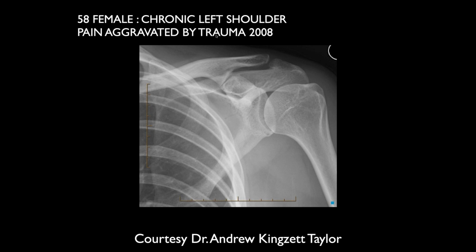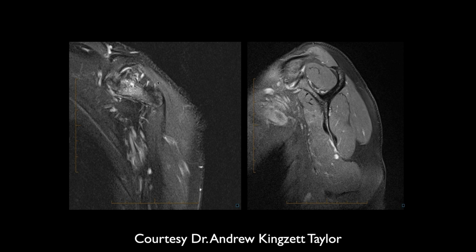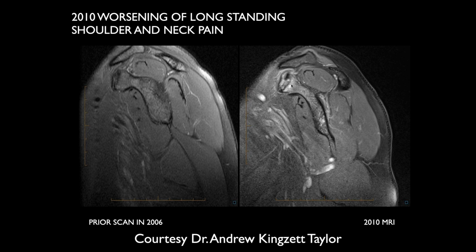Yeah. The other thing that you can see sometimes is kind of partial ossification, and then what you can have is actually an articulation here instead of having the ligaments, and you can get a lot of variation in the normal anatomy here. This patient was painful in this area, and if we got an MR scan, we can see why. Basically the patient has a pseudo articulation there in that particular area, and this has a lot of degenerative disease and was causing a lot of pain. So that's a pseudo articulation of the CC ligament.